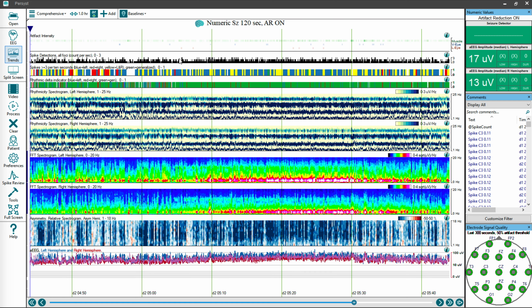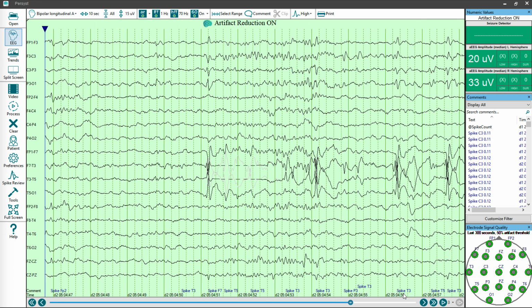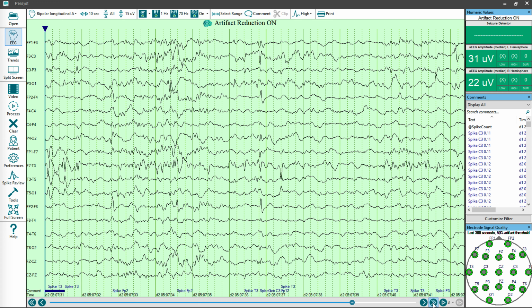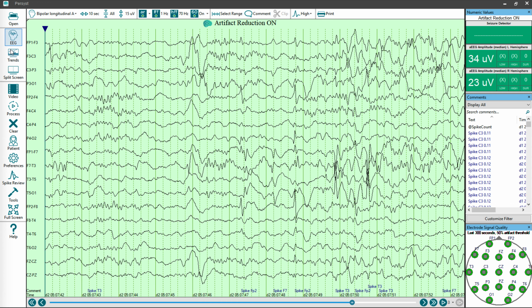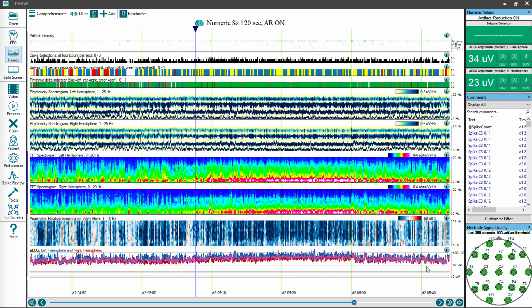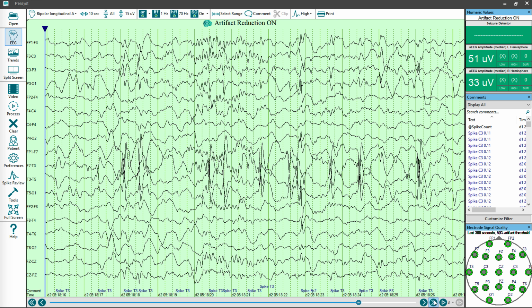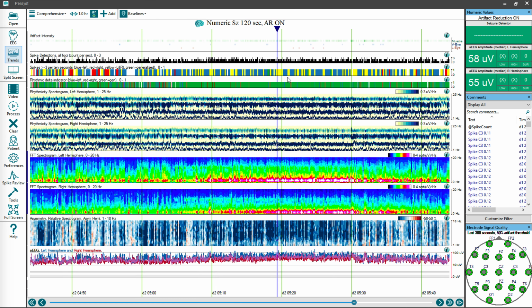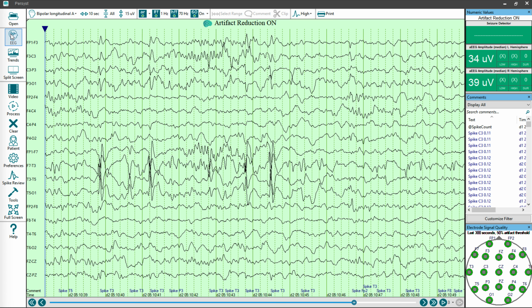And well, it looks like the spikes are picking up here. I'm just going to click at this point, click the EEG, and page forward, and it's like, okay, there's some spikes in here, but I want to go to where it seems to be a little more consistent. So let's try at this spot, because this line gets a little more solid here. We'll click the EEG, and that looks more like it. Okay, so I'm going to pick this spot to mark my range, where this gets to be a little more consistent. I'll start here, go to the EEG.